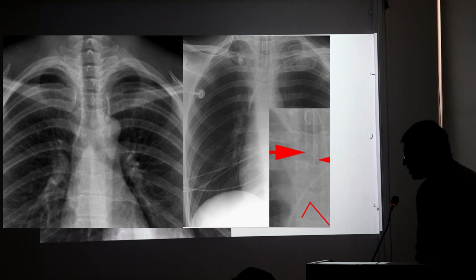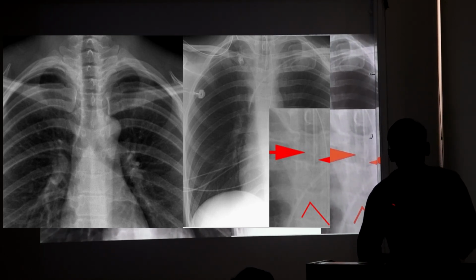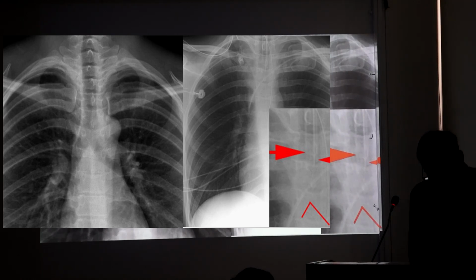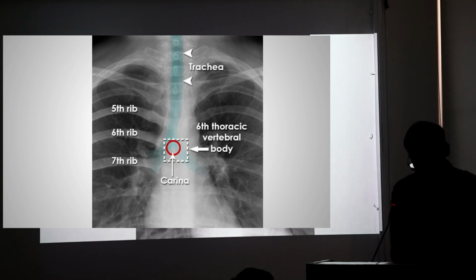Next. Can we trace, is it visible, the air column, the trachea dividing into left and right bronchus? We have an endotracheal tube; can we see the radio-opaque endotracheal tube? What is the ideal position of the endotracheal tube? Approximately 5 centimeters from the carina. In most individuals, the carina is located between the levels of the 5th and 7th thoracic vertebrae.